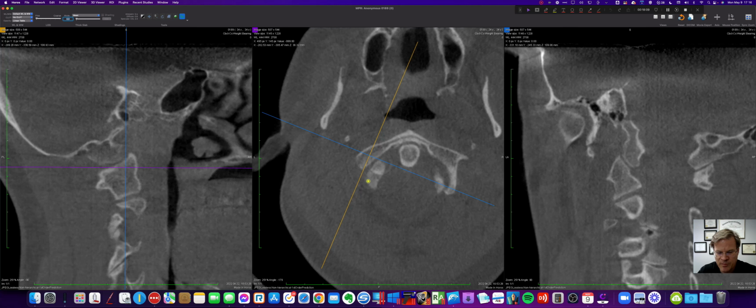I've already set this up, but you can see the other one disappeared. We'd have to move things around to find it. So I'm okay at this point. If you would see it on the thicker one, you could just leave it there. Now again, see that? If I try to pick up that end, it's actually going to start rotating the axes because I've got that circle there. So I'm going to get rid of the axis, pull that way up, and then bring it down. Right, boom. Good, good. I'm going to look at this, posterior 1/3 of the condyle.